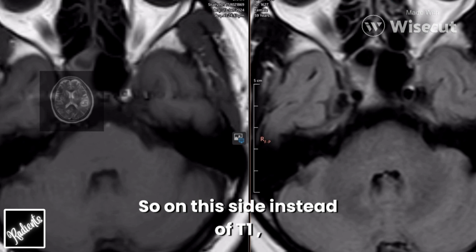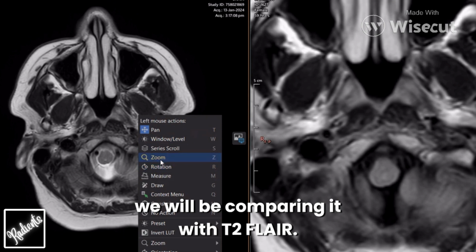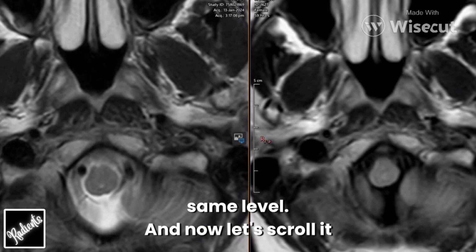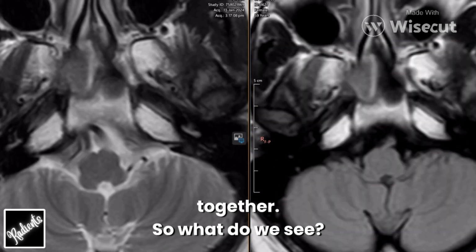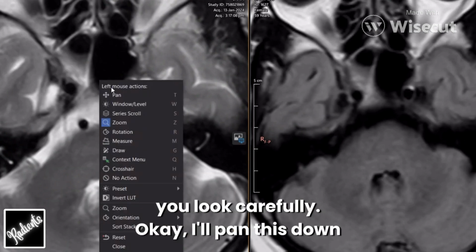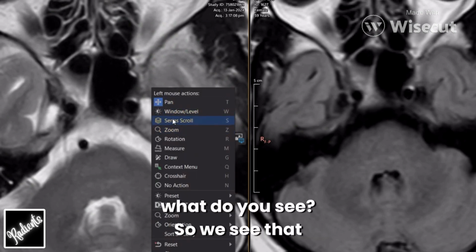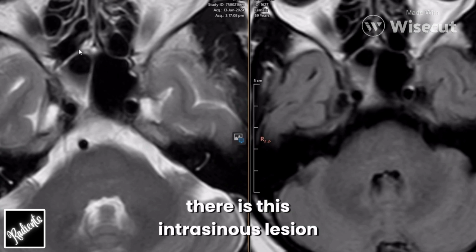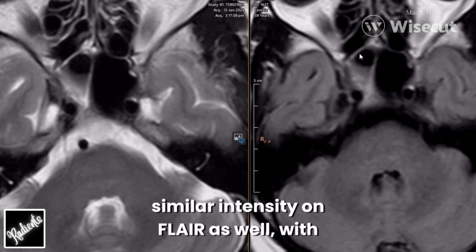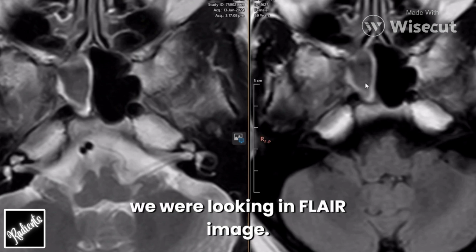So on this side, instead of T1, now we'll be looking at T2 and we will be comparing it with T2 FLAIR. So let me zoom this image as well for you at the same level, and now let's scroll it together. So what do we see? Let's have a look. So this lesion here, if you look carefully, okay, I'll pan this down at the same level. If you look carefully, what do you see? So we see that there is this intrasinus lesion here, which is markedly T2 hypointense, similar intensity on FLAIR as well, with similar findings in the rest of the sinus as we were looking in the FLAIR image.